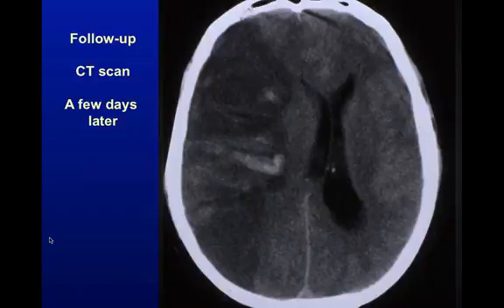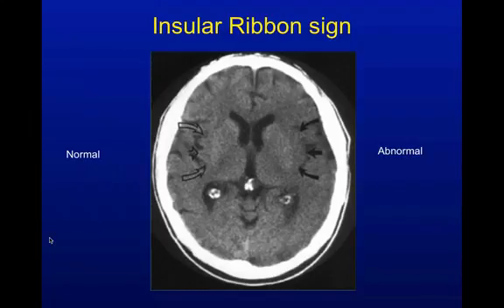Here's a follow-up CT scan on that same person. Okay, they're going to wipe out that brain. Big mass effect. In fact, looks like they've actually got some spontaneous hemorrhage into the infarct, which happens not infrequently, especially with those large vascular territory strokes. Spontaneous bleed. It's not TPA related. It's just bad tissue, and as it breaks down, the blood vessels break as well.